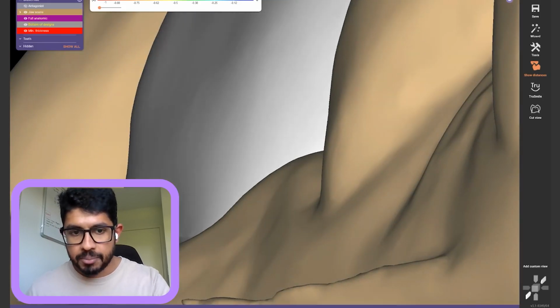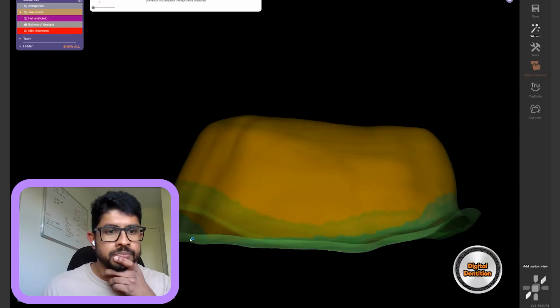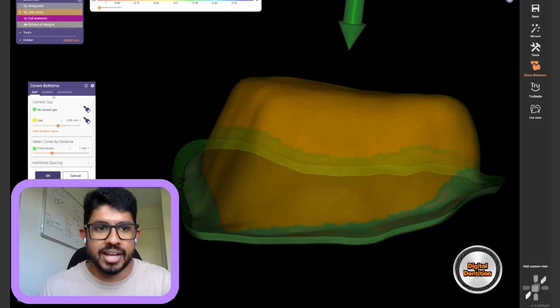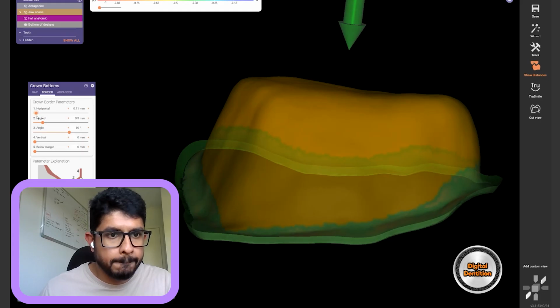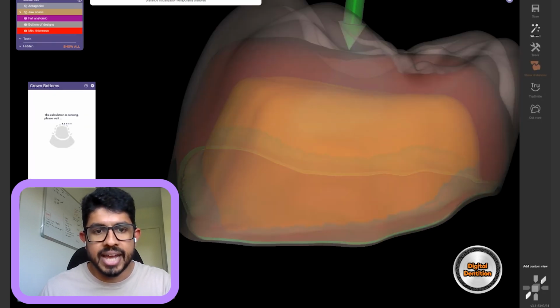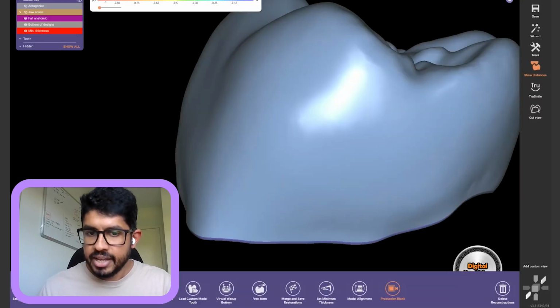It just takes a few seconds to adjust that. But this kind of ledge that you have over there, if I go to the bottom tool, you see that little overhang that it just put in there without even asking you. It's because of these tools over here. If I take this down to 0.1, and I'll take this down to 0.1 as well, wherever 0.1 is. Okay, so let's say I hit OK. You'll actually notice how your crown adapts. You see all of that overhang that was there.